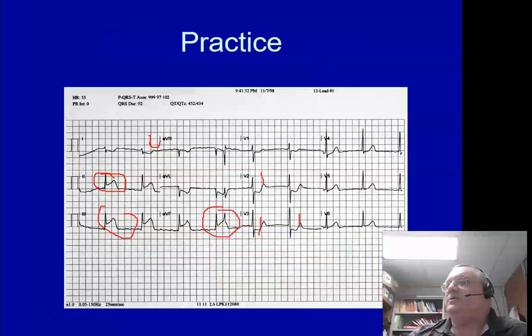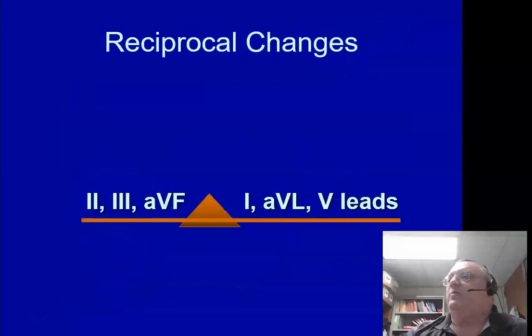Oh, wait a minute. Let's go back to here. So this one was looking at the lateral wall, all right? So if I draw my little heart up here, it was looking this way, right? And then the inferior wall is looking from this way. So at this point, it's seeing damage down here. So on the other side, that means it was showing the depressions. It is a confirmatory finding for what we have going on.